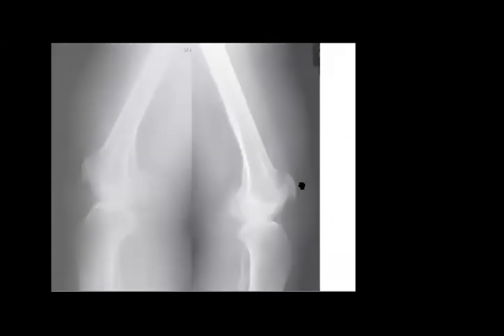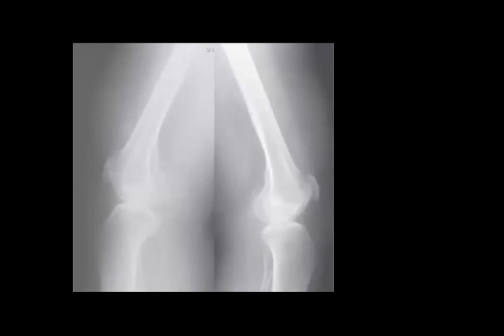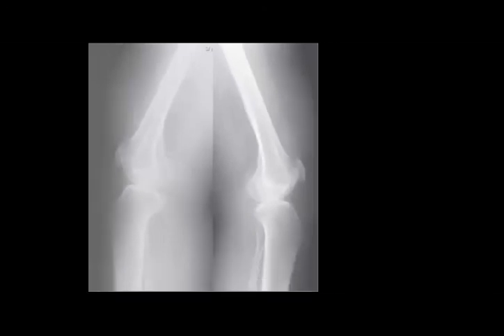And when you go to see the patella in this patient, how do you describe it? Hypoplastic, perfect, Marwa. So yeah, nail patella. So the finding is hypoplastic patellae with posterior iliac horns, pathognomonic for something called Fong disease, which is hereditary, and the other name of this syndrome is nail patella syndrome, right?